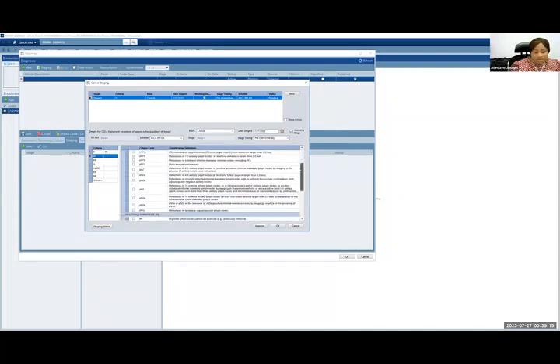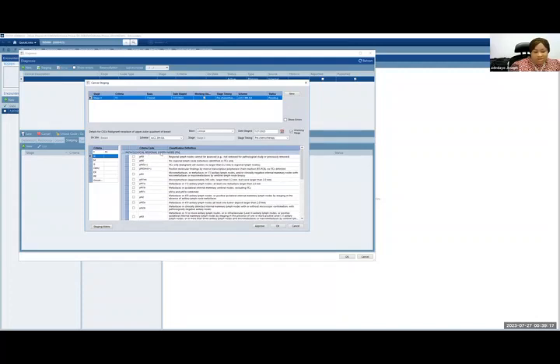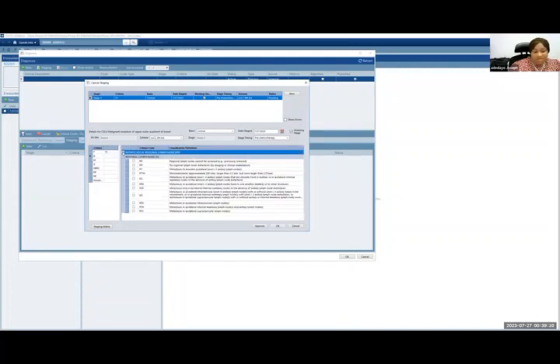Then we go to the nodes. So if you look up here, this is pathological node staging, meaning that this is based on findings at surgery. So you need to close that and come to based on findings at clinical examination. So we're going to say that she is a stage N2B, N3, no, let's pick an N3. So she has ipsilateral level 3 axillary lymph nodes. She has internal mammary lymph nodes, or she has metastasis in supraclavicular lymph nodes.